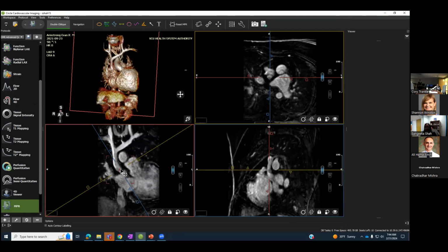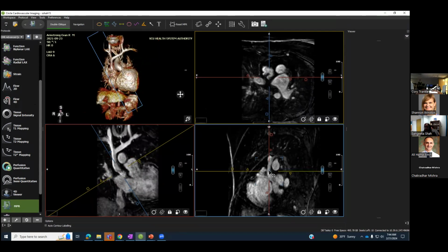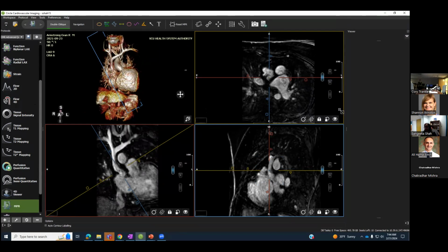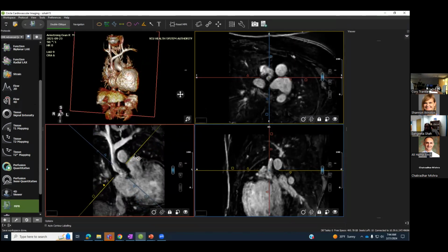And you can see how this SVC, what we call the SVC baffle, is so narrow, and it measured about 1 centimeter. And the important thing in this for us is that, one, this can cause SVC syndrome, headaches, but the other thing is often these individuals, as you saw, based on his RVEF, need devices, and they might need a pacemaker because they've developed sinus node dysfunction, or they might need an ICD.